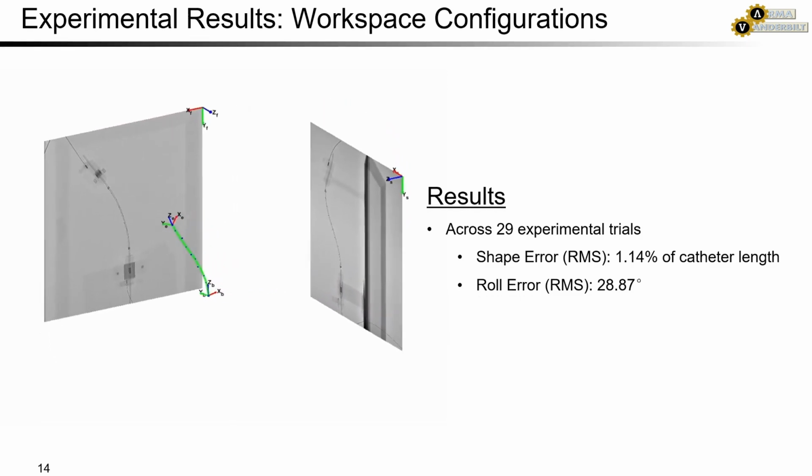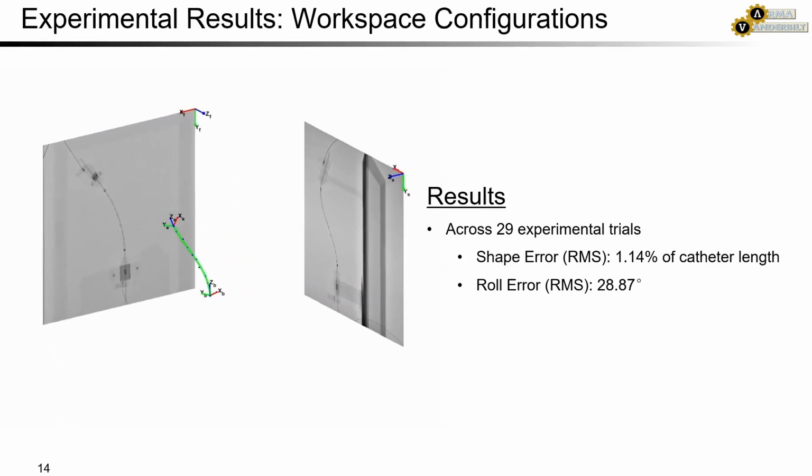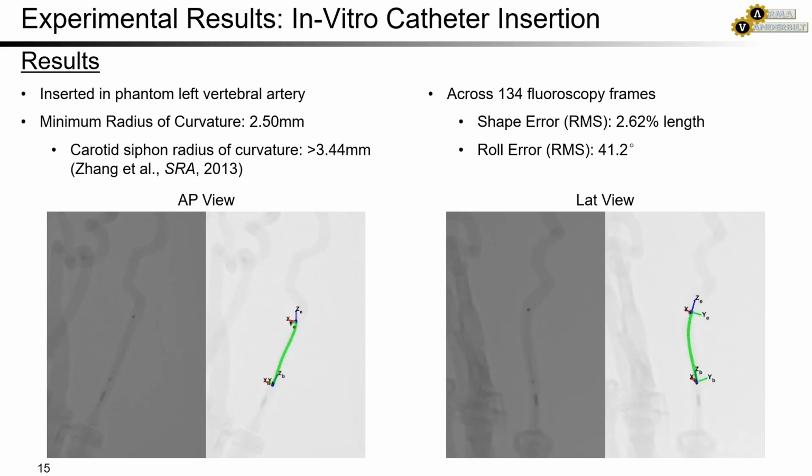The error of the backbone rotation was found to be on average 28 degrees, which is acceptable considering torsional transmission losses can be as high as 180 degrees. An additional 1.4 mm outer diameter prototype was made from a standard microcatheter and was inserted in a mock vertebral artery. This demonstrates intended clinical use of tracking catheters within the neurovasculature.